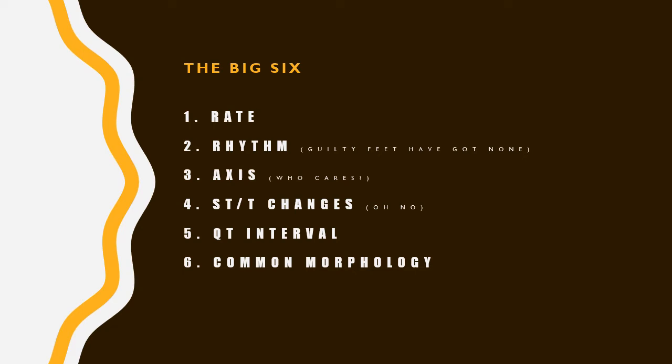Armed with that knowledge, we kind of understand how the ECG works now. This serves 2 purposes. 1, to make you feel like less of a fraud, and 2, this sets the stage for more difficult rhythms, like when pacemakers come into play, when thinking about axis and hypertrophy and all that stuff. But that actually doesn't really matter for 90% of ECG reading you do on a regular basis, which is mostly just pattern recognition. Let's work through how to read an actual ECG.